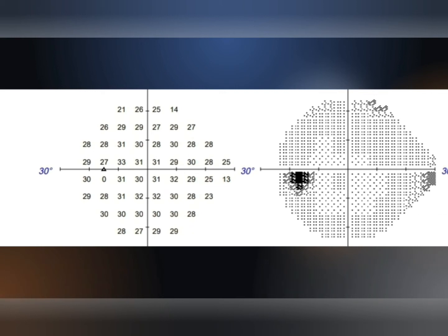So don't directly give your comment in glaucoma diagnosis only by seeing this raw data, because the machine has its normative value depending on specific age. So these raw data are age specific. The machine compares this raw data with its stored age normative value and then measures the deviation from this raw data and plots it in the total deviation numerical plot. So before giving any comment, look at the other map also.